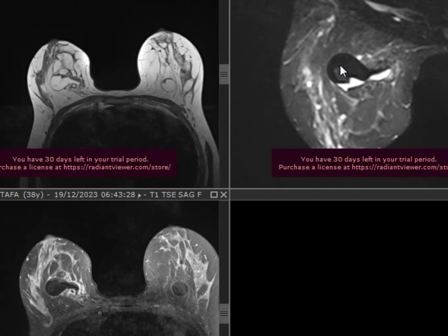Which one? It's an oil cyst containing fat and fluid and other contents. So it looks like a dermoid. And the funny thing, imagine the doctor is a very, very good ultrasonographer, one of my favorite friends. Anyway, she referred it to me.